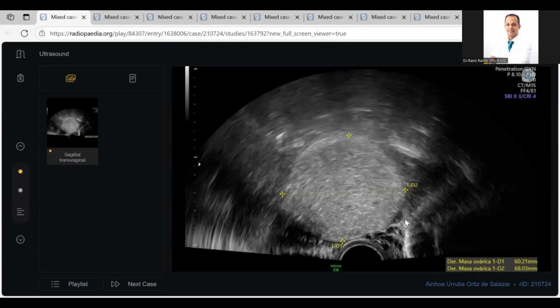Is fibroid hyperechoic like this? Usually it is hypoechoic. What else? If I told you this is an adnexal lesion, I would think about a dermoid tumor containing fat, but it's usually more heterogeneous. What will you do next? I would confirm it. I would ask for a CT scan or MRI, preferably MRI with contrast enhancement of the pelvis.